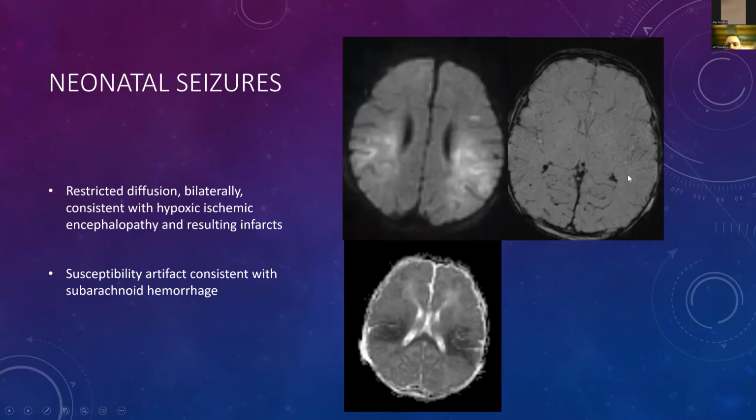Of note, especially if you have susceptibility artifact in the posterior fossa, that can be a cause for sensorineural hearing loss. These findings produce a constellation of sequelae, including infarcts and hypoxic ischemic encephalopathy.